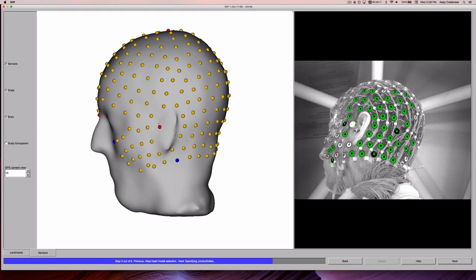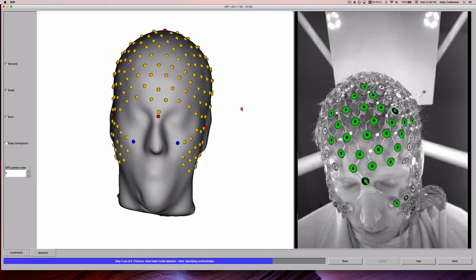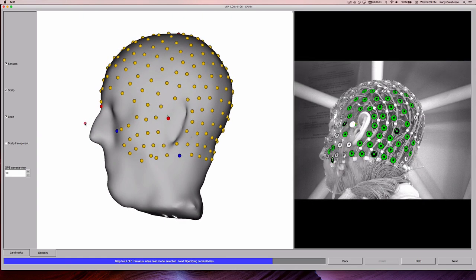Evaluate the relationship to the following anatomical features: the Nasion and brow point ridge here, the left and right face points and their relation to the nostrils, and the preauricular and neck points to the ears. Keep in mind you're not evaluating the relationship of the sensor placement to other sensors. You're trying to get the relationship of the sensors to the anatomical features so that they match in both views.